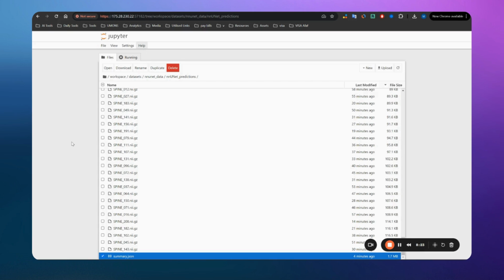I will just show small videos where we use the models. It can be a Tkinter application, or a Streamlit application or something like this. So it will be just ideas so that you can think of how to use it. If you already have your production pipeline, then you don't need this part. But otherwise, if you are still looking for where you can go with this final model, then I will give you some ideas that can help you with that.